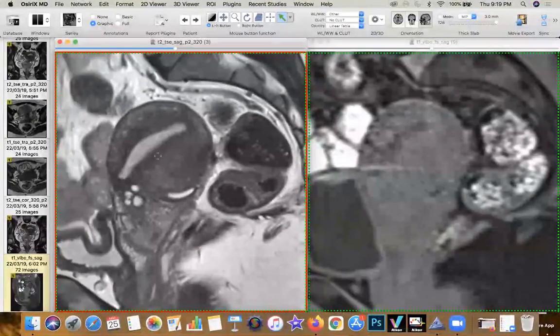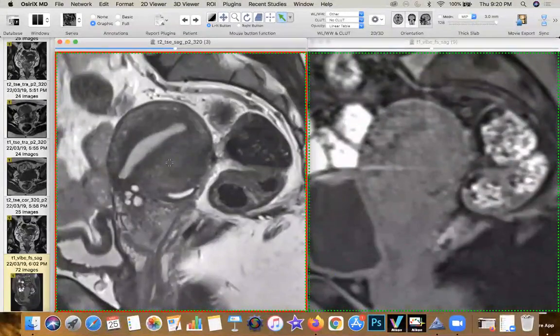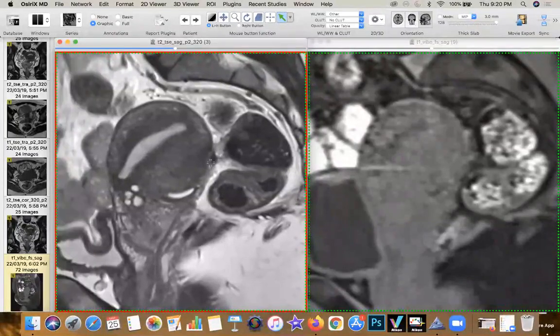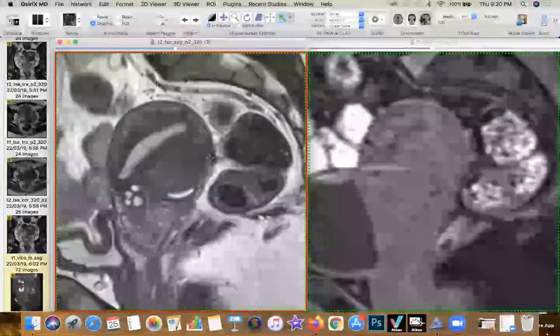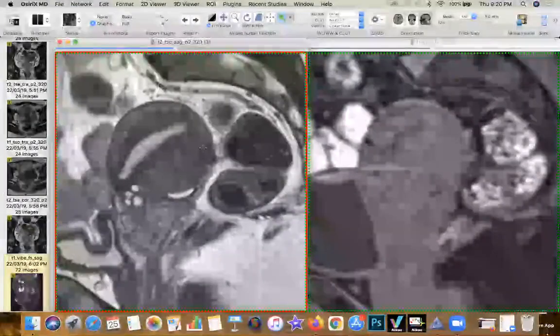Alternatively, if you start seeing dilated endometrial glands within the junctional zone thickening, that's more of a sine qua non feature. They could be hemorrhagic or non-hemorrhagic in nature. However, there is a propensity. So that's typical uterine adenomyosis. But when you get this kind of a picture, where you get hemorrhagic and fibroinflammatory tissue coating the serosal surface of the corpus, there's a tendency for the hemorrhagic endometrial gland sitting up here to invade the subserosal uterine myometrium.